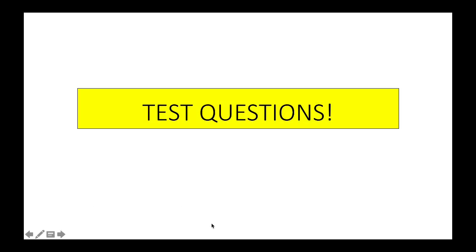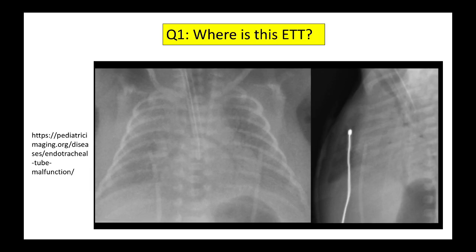Okay, let's go over 3 test x-rays for some self-testing. Make sure you've really absorbed this. So the first x-ray, where do we think this endotracheal tube is? Is it in the right place?